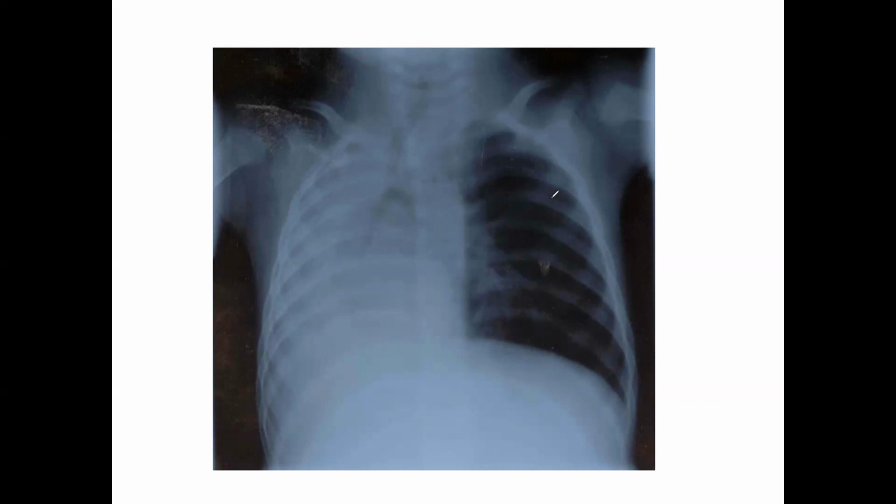When you're looking at the chest X-ray, you want to make sure that the patient is properly oriented. We also want to look at the clavicles. I've got the color red here, so I'm going to put a line over where these clavicles are. Those clavicles should be pretty well straight across. You can see that these clavicles, although not terribly uneven, are uneven, which is going to indicate a little bit of rotation for your patient.